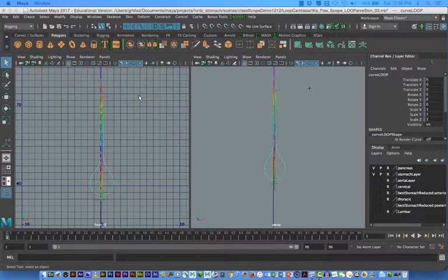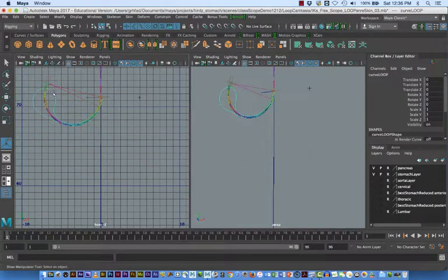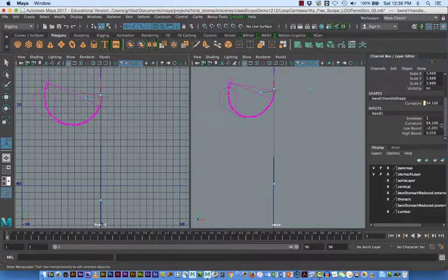Okay, we've got our bend, our locator that allows me to select the bend control. The bend control is now moving the tip, the flexible portion of the scope, as well as the snare, this little snare we've created. Okay, I can go back, reset that bend curvature to 0.